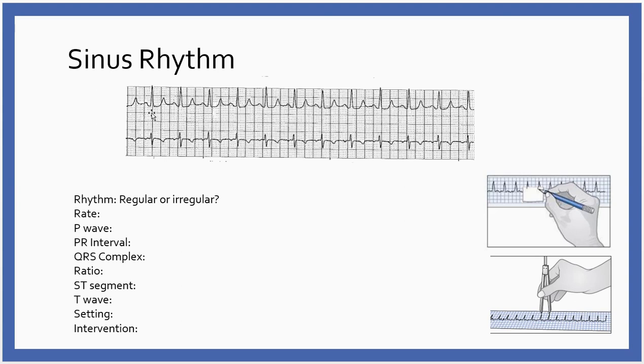And so this is my QRS complex. Now notice, this doesn't have a Q wave. Q wave should have been a downward deflection. All I've got is an RS wave. I'm still calling this a QRS. So my QRS complexes, I've identified them, and I do need to make sure they all look about the same, which they do. Okay, they don't change in shape. It's not like I've got this complex here and then something different there.